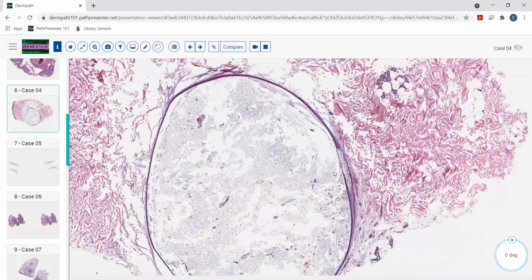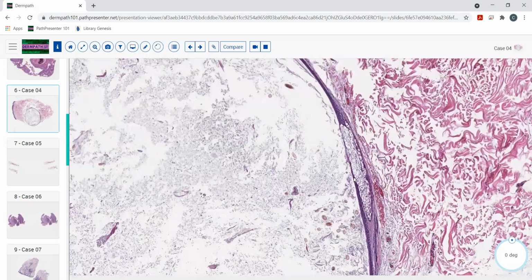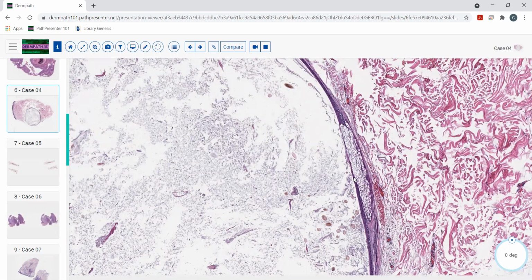And I'd say it's kind of the exception rather than the rule that you actually get a sebaceous lobule in the wall. I think all this is telling us that this is probably analogous in some ways to a steatocystoma. It's probably that same type of cystic epithelium that is being recapitulated here. It's not really the sebaceous duct, but it's probably a cyst that's really at the level of the infundibulum, maybe kind of where it's beginning to form the sebaceous duct, if you will.